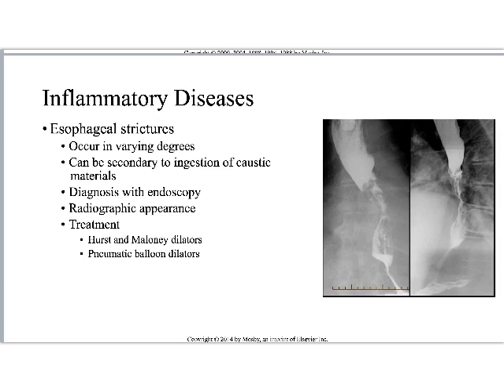The radiographic appearance, again, is going to be a string-type sign, right? You can see how the barium looks like it's got a string of barium, as well as this kind of almost like, I don't know how to describe it, but almost like webworks of barium. The barium's working through a scarred area, right? It's working past scars, okay?